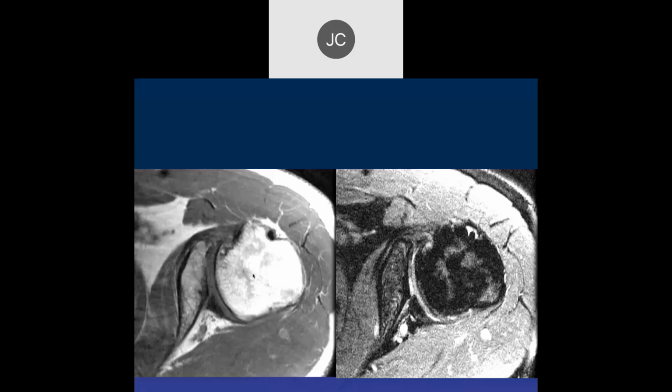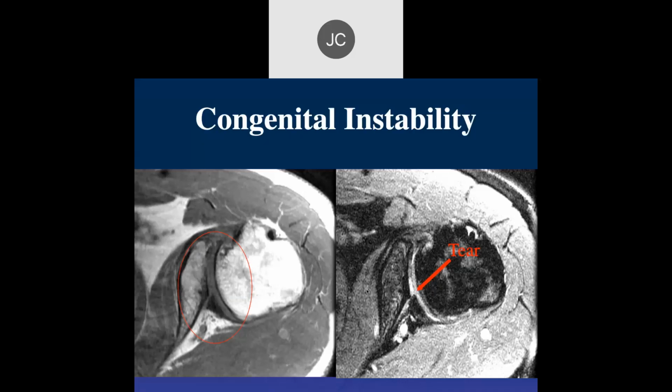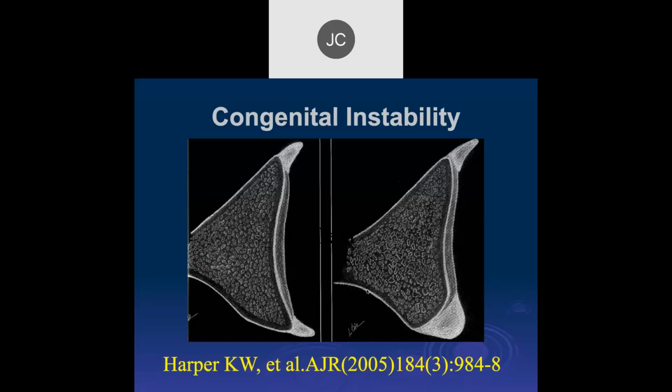The head doesn't look round enough. It looks like a congenital anomaly. Yeah, this is a congenital anomaly. That's right. And there you can see the tear at the base of the large labrum. So it's congenital instability.